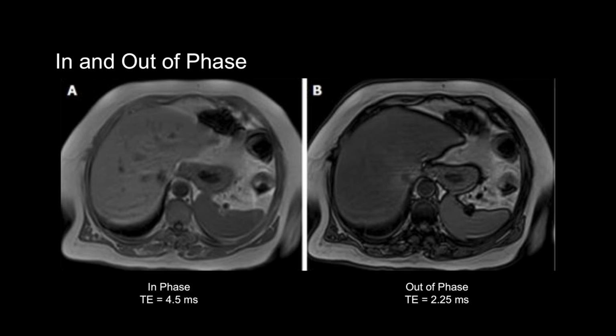If you take away one thing from this slide, know this. You've got to know how to detect intravoxel fat and iron/susceptibility artifact on the in- and out-of-phase images. Namely, if it drops on the out-of-phase image, it's fat, and if it drops on the in-phase image, then it's susceptibility artifact like iron.